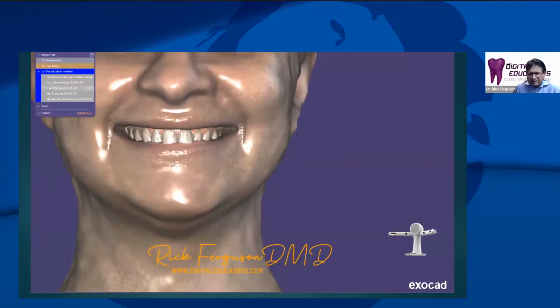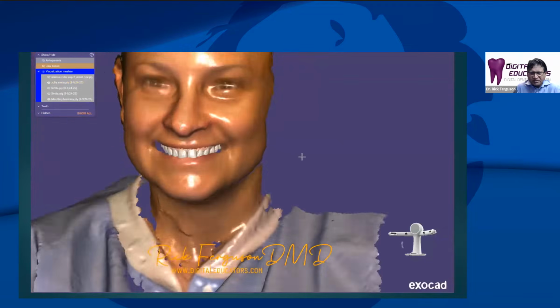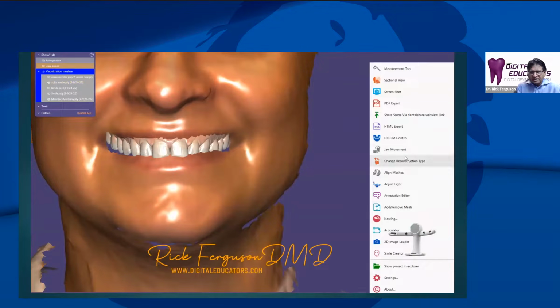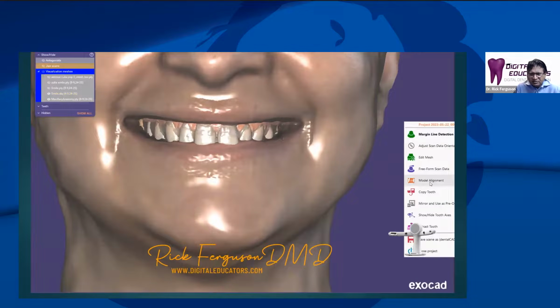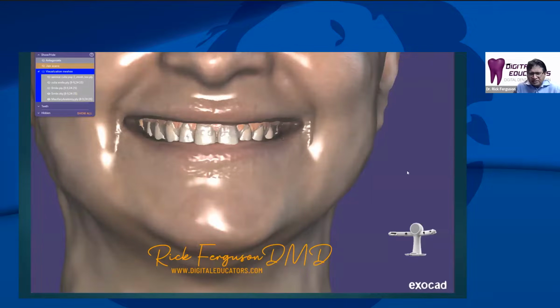The problem with that is that we're matching points just on the front teeth, because that's really all that's visible in the two scans. To get it done properly, you really need to go further back to get the occlusal plane right. Matching the front teeth might get the cant correct, but to get the occlusal plane right, you need to match in the posterior as well.